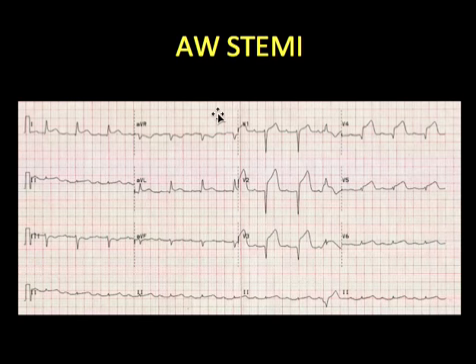This is anterior wall STEMI or anteroseptal STEMI because there is ST elevation in V1, V2. This is the baseline. This is about 5 mm ST elevation, V3, V4, V5, V6, and also the lateral wall looks a bit involved here. There's ST elevation in lead 1 and AVL too if you just observe. So it is anteroseptal lateral wall MI.